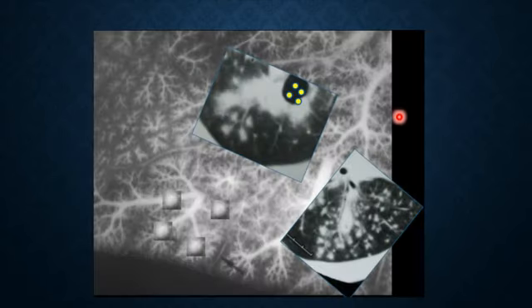What happens is that these nodules are, this is a bronchogram, this is a normal bronchogram. You can see each bronchiole and terminal bronchiole is ending in multiple alveolar sacs, and each one is forming this thing that's called what? Lobule. This is a lobule.